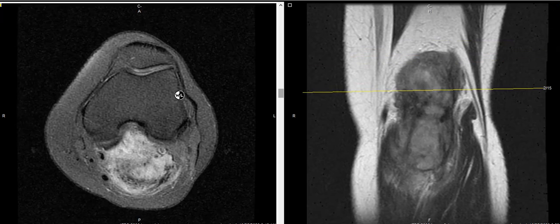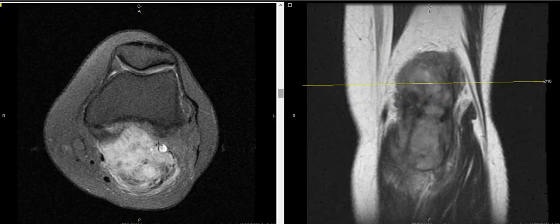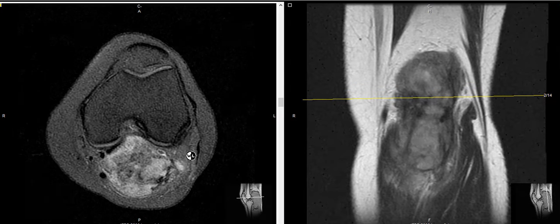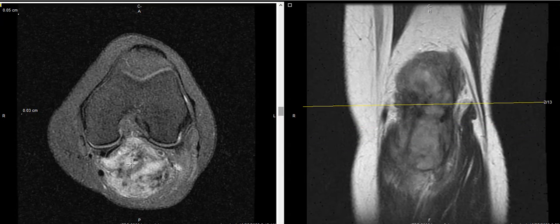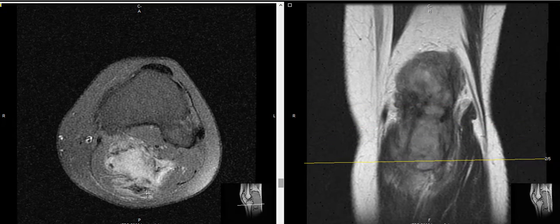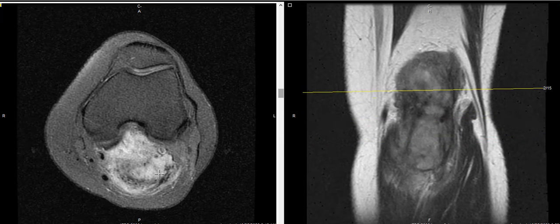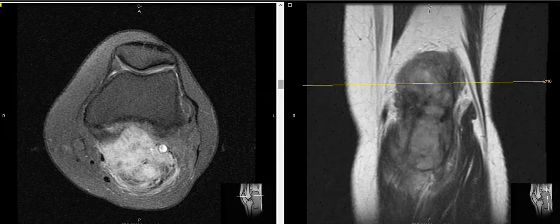As a radiologist, it's hard to say for sure what this is, but we describe, is it well-defined or poorly defined? And is it infiltrative? Now in this case, it's poorly defined. We don't see sharply defined margins. We do see it infiltrating the medial gastrocnemius muscle, also lateral gastrocnemius a little bit, so it goes right into the calf muscle. So it's a large, poorly defined, infiltrative lesion. And so we cannot say that this is benign. It looks like this could be malignant.